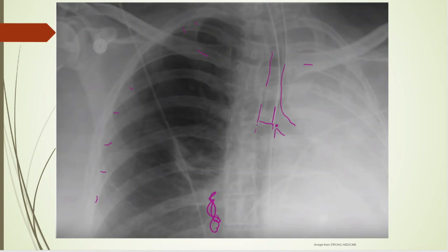But you can at least see that there's no ventilation, or the lung's not moving on the left side with ultrasound, and then you could wonder why. But really, your stethoscope here should pick it up. The nurses should pick this up.